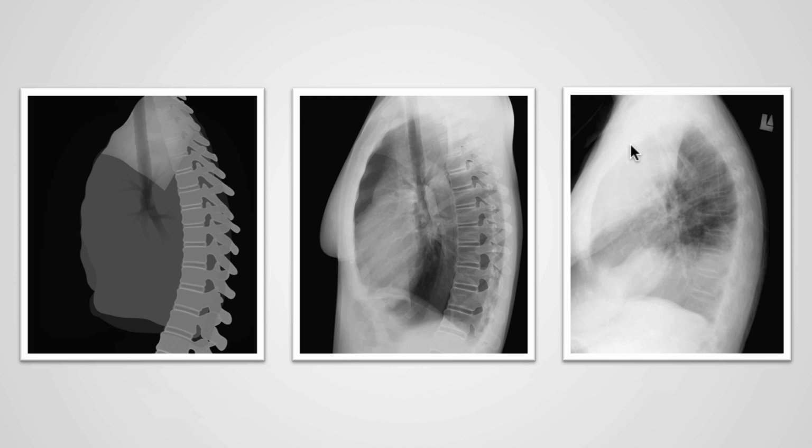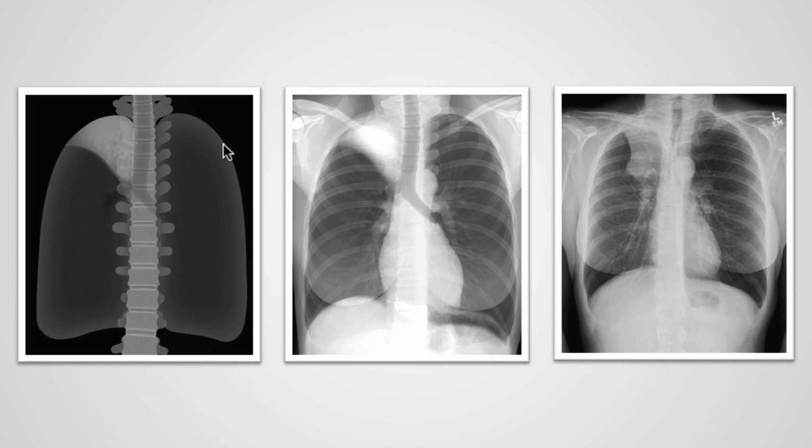And here we have a representative case with the oblique fissure identified posteriorly that is displaced significantly anteriorly, and the horizontal fissure is displaced in a superior direction. With more advanced collapse of the right upper lobe, the opacity within the right apical region will look more white, and the displacement of the oblique fissure will be more complete.